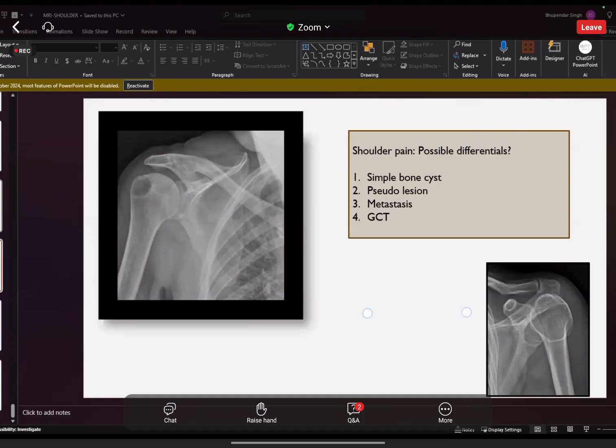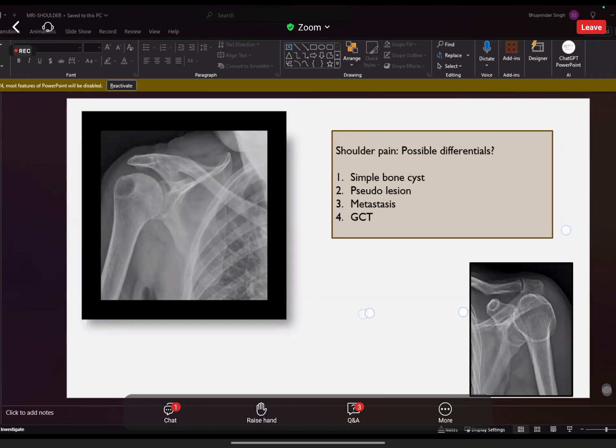I feel compared to PDFS images, non-FS images are more important, because they give us a good idea about fibrosis in the rotator interval. So I feel effacement of fat or fibrosis in the interval is more important than coracohumeral ligament thickening for confirmation of rotator interval synovitis. Yes, very well explained. It is mostly eyeballing, but some authors say that 2 to 4 mm is the normal coracohumeral ligament thickness, and more than 4 mm should be called coracohumeral ligament thickening.